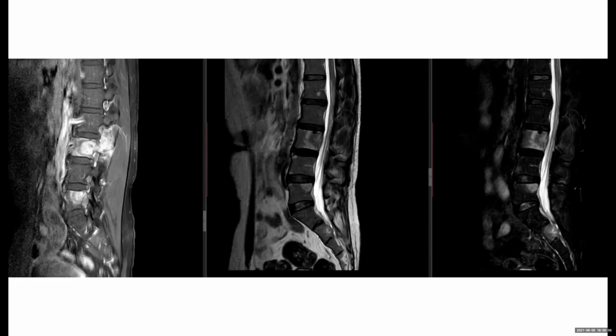The process can be metastasis, or my primary differential will be metastasis. It can be multiple myeloma, or it can be any inflammatory process. The lower down differential will be tuberculosis. It can be lymphoma. Yeah, it was metastatic bony lesions. Okay, ma'am.